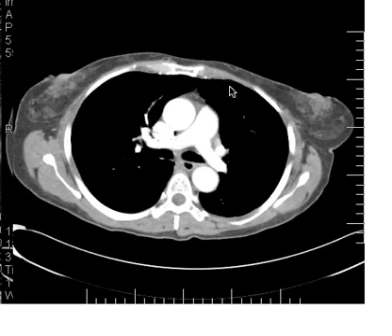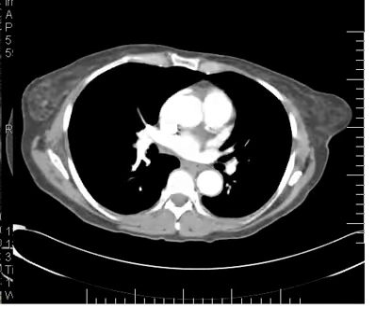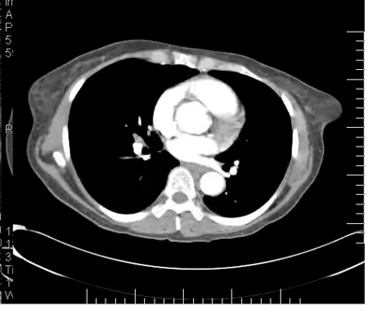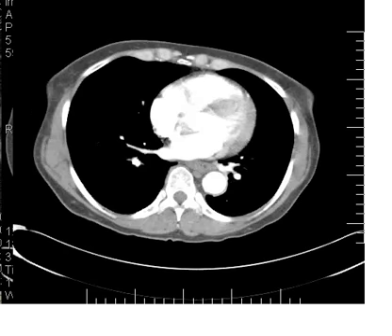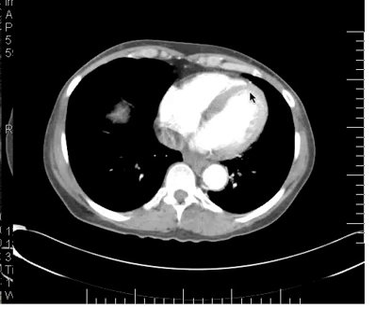Let's go down and look at the main pulmonary artery here, and we should see it coming into the heart, or arising out of the heart, okay? Here we go. So now here we are at the level of the heart, and here we can see a pretty good profile of the heart, right and left side, and of course the left ventricle can always be pretty readily identified because of the thicker myocardium, plus the fact that it's more posterior and somewhat leftward.